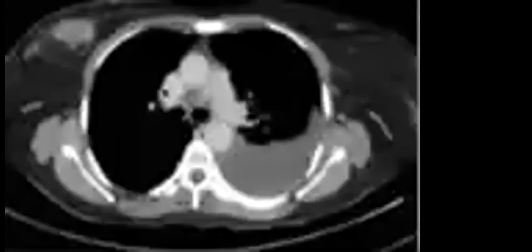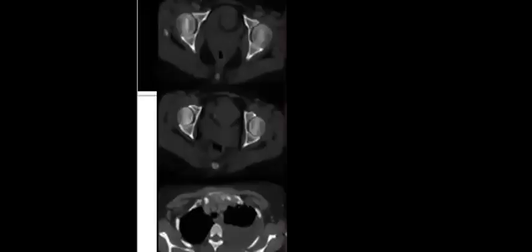And by the way, this is the selected image of the breast. So this is the right breast cancer, and this is the pleural effusion. Yes. So at least you mentioned that there is pleural effusion and right breast lesion.